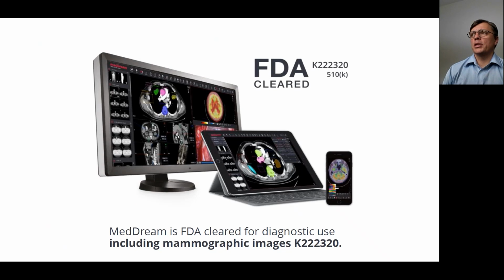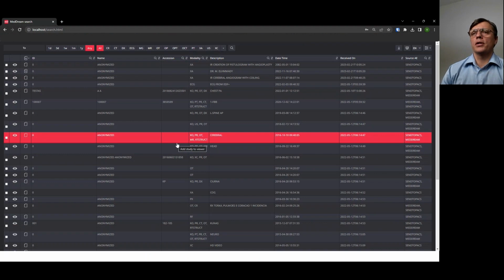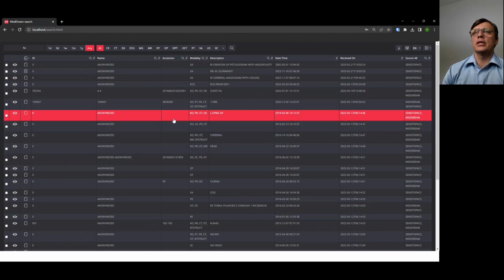Yes, MedDream is cleared already, and now I will switch to a presentation for you to see the features themselves. So I prepared my local installation. I hope everyone sees.